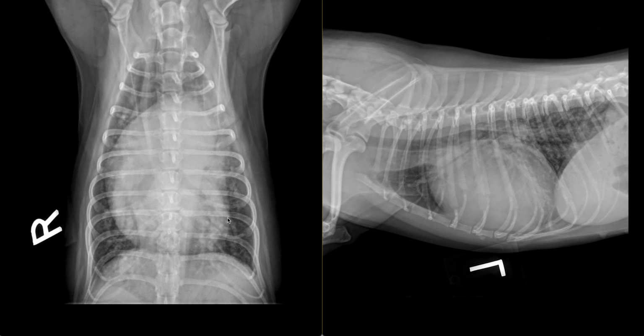The opposite is true as well. When the vessels are overperfused, the distension of the vessels may increase the overall opacity of the lungs. In this circumstance, deep inspiratory image capture is ideal, as this will help determine if the boundaries of the vessels are sharp, meaning that the opacification is coming from the vessels, or if there is less distinction of the margins of the vessels, meaning that there may be concurrent change in the interstitium. If the image is expiratory, there is crowding of the vessels, and this assessment is made more difficult.